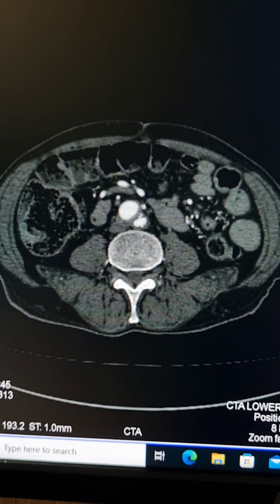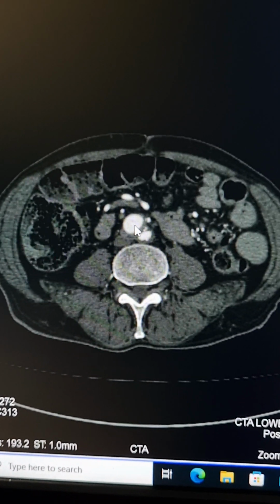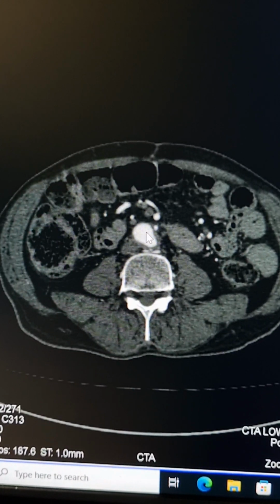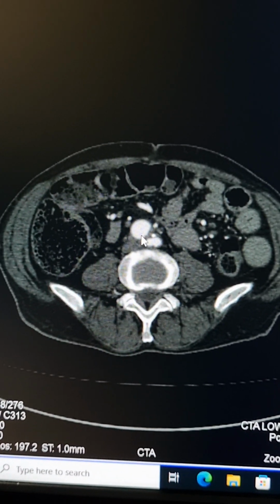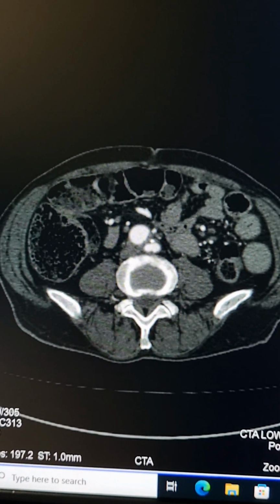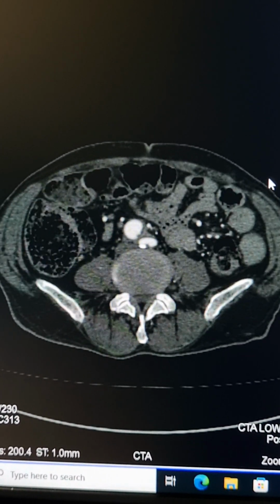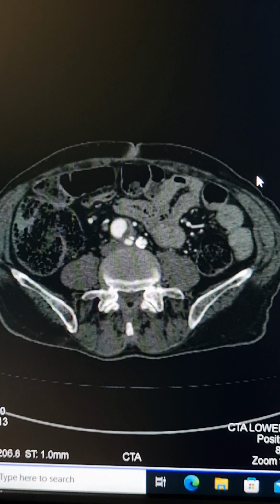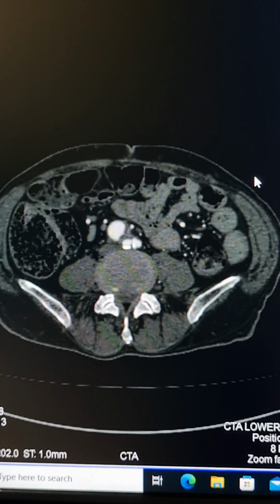Now this is the aorta which continues downwards. This is the graft here. This one is the bypass grafting which was done previously. In fact, the patient came from far off and didn't have any previous records of any previous surgery, because multiple treatments have been done with this patient, percutaneous stenting and operative as well.